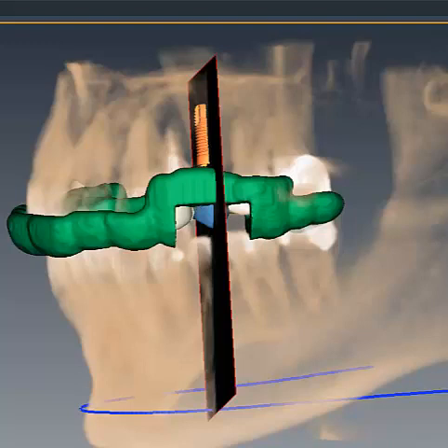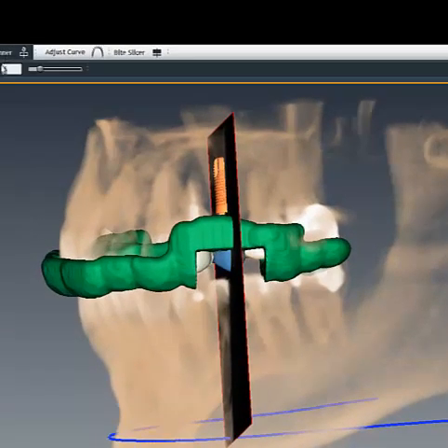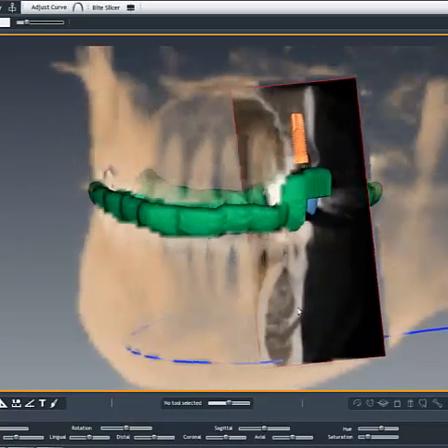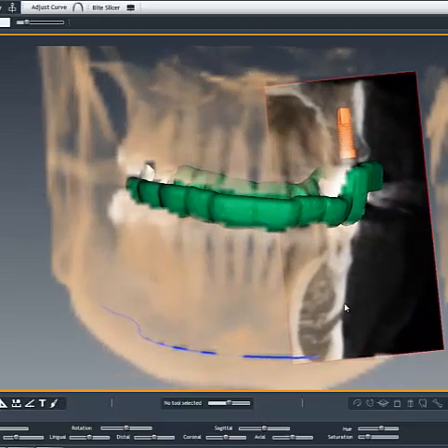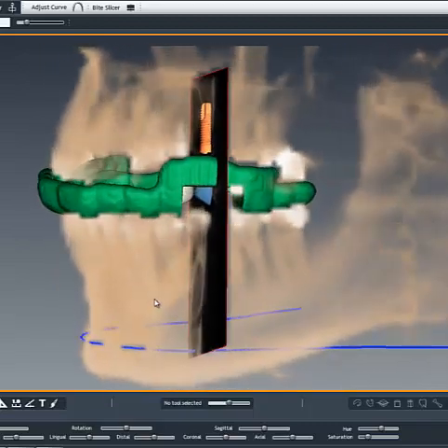And if I were to now go to the spinner view and run the spinner view around that implant in there and take a closer look at the cross arch slicer that we have in there, we can take a closer look at it. This is the implant that we have relative to the bone, relative to the surgical guide.